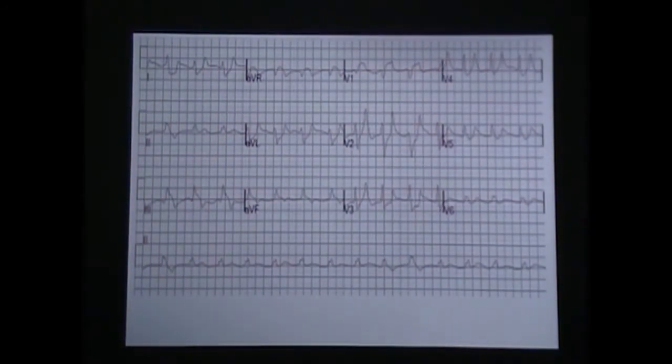For this, the first time I looked at it, I was like, that's a lot of business going on there. So I had to really slow down, until I cued in on these T waves, widened QRSs, they weren't really slow, lacking P waves. I was slightly baffled for a few seconds, and then I was like, okay, and boom, you start going down that checklist of what you're going to get with hyperkalemia.